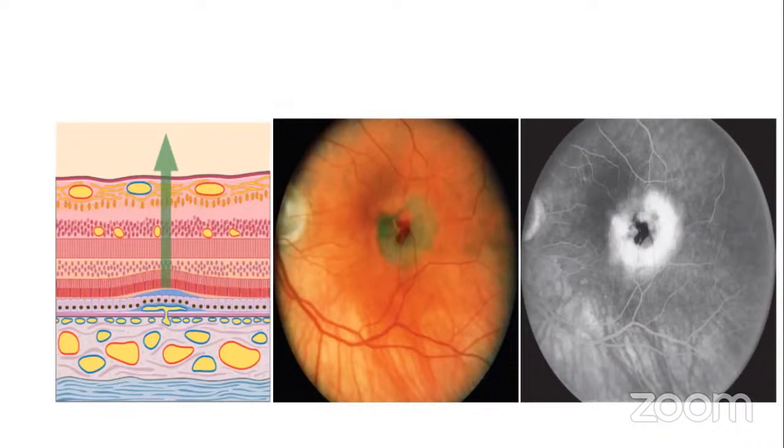Okay, across the defects, you have, these are meant to be choriocapillaries. You have some form of new vascularization in here, and then some bleeds here that have lifted the RPE up, and you have both a sub-RPE and a subretinal accumulation of blood or new vessels.